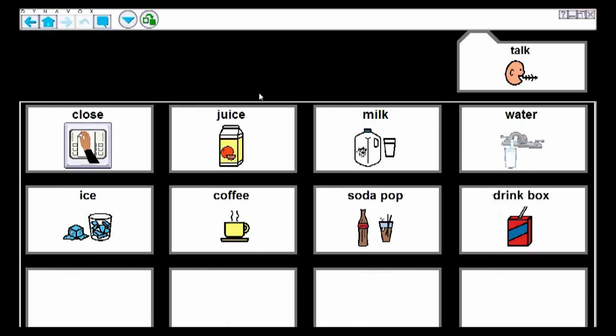So I'm going to do that by clicking on the top row here. We've got the title bar, and this button at the top that has the little green squares on it is our modify button. I'll come back to the title bar in a moment and explain some of those other icons, but we'll look at modifying and adding the word tea to a button.